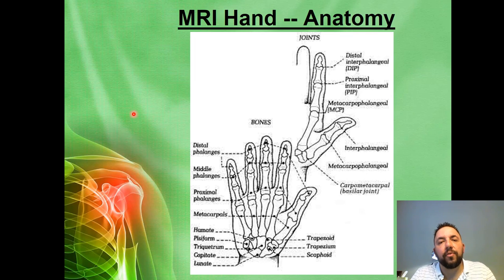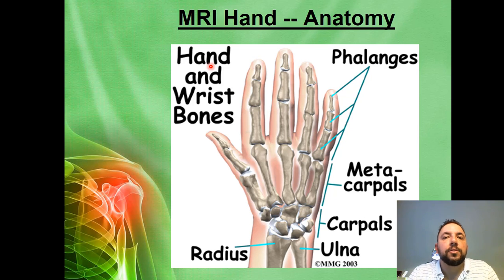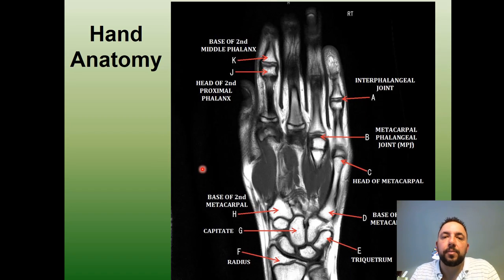Coverage, obviously getting from the metacarpals and all the way through the distal phalanges. This is really why we want to have as much possible coil coverage to get optimal signal as we can. So the wrist into the hand, we have a particular radiologist that anytime we're imaging the hand, if we catch radius and ulna, our field of view is too big. So be mindful that we can get into the carpal bones, but if we're going all the way into the radius and the ulna and we haven't lowered our field of view, then our spatial resolution could be improved, and he would be wanting us to optimize that as much as possible.